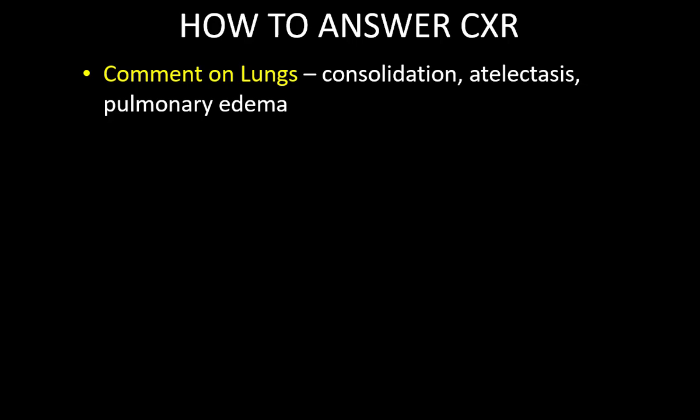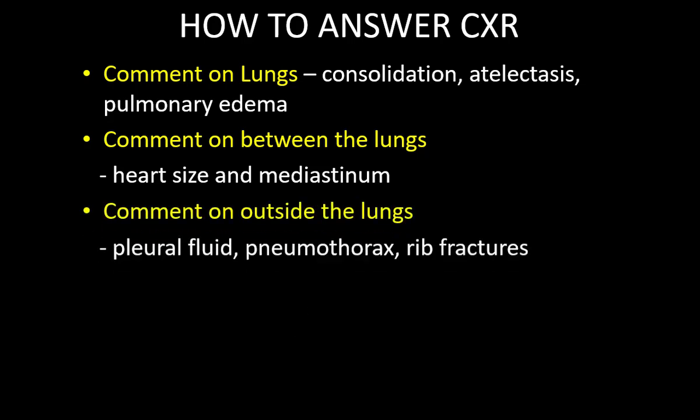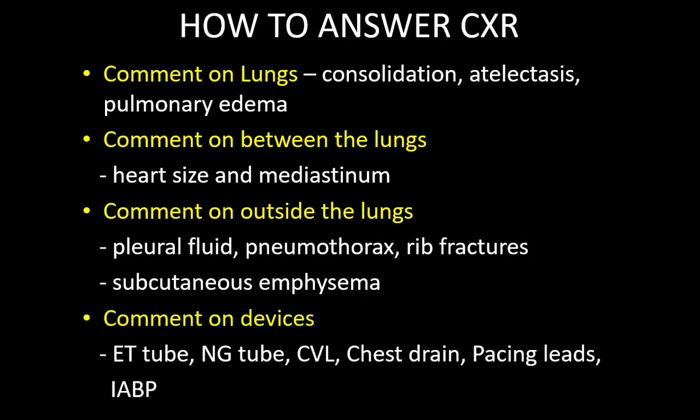Comment on the lungs, then comment on the consolidation, atelectasis, pulmonary edema. Comment on between the lungs, the heart size and the mediastinum. Comment on outside the lungs: pleural fluid, pneumothorax, rib fracture, emphysema, and then comment on the devices which can be there.